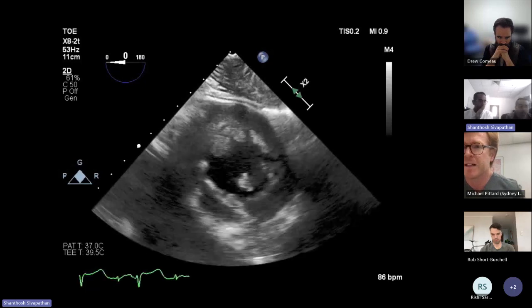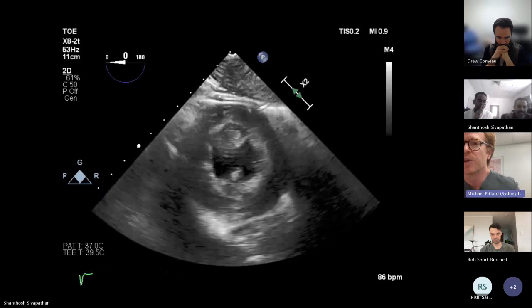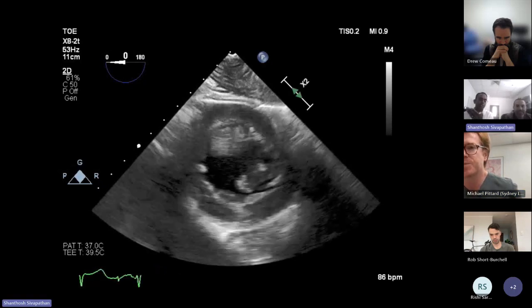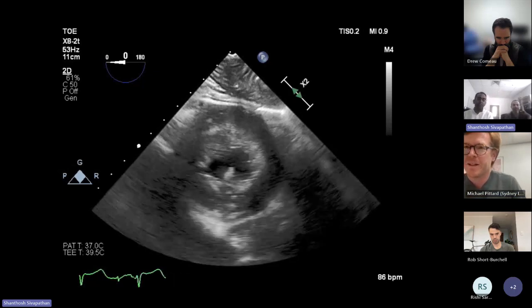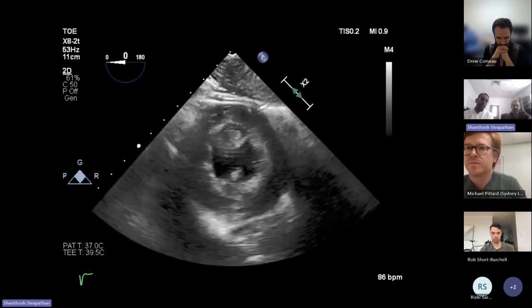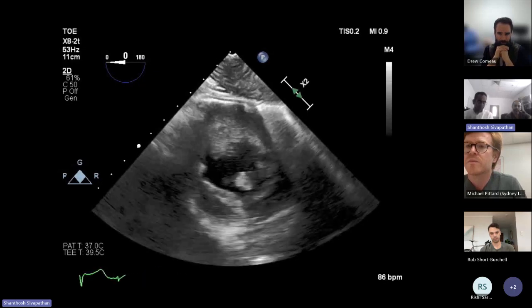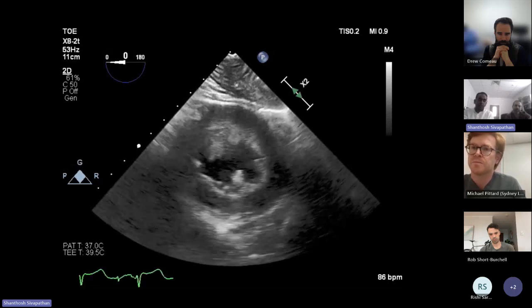Yeah, I was going to say, what walls are akinetic? The inferior and inferoseptal wall, I think. Yeah, 100%. With the TOE images, it's reversed, so you've got to be mindful of that compared to your transthoracic. You can get put off by it. So you're quite correct. You do obviously have some hyperkinesis there. To be honest, I don't know what those changes are, and that's where your pap muscle should be, and whether that's post-surgical changes or a thrombus. That's a very good question. You've got to ask that question in that case.